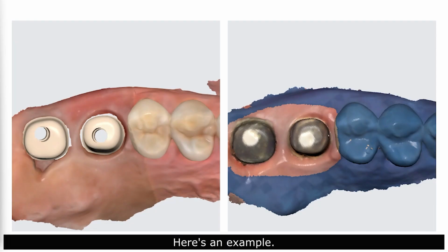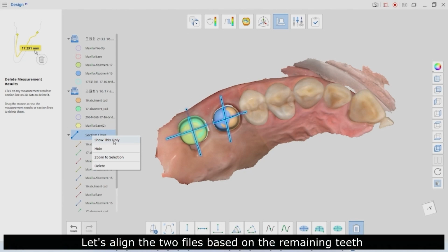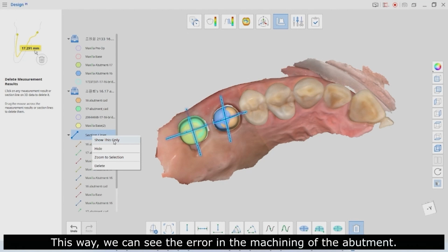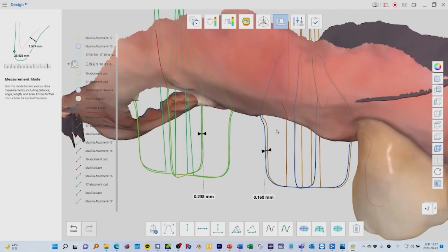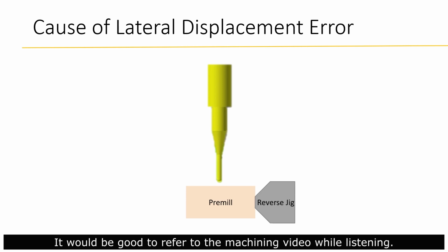Here's an example. On the left is the design file, and on the right is the scan data of patient intraoral connection. Let's align the two files based on the remaining teeth and compare the difference between the design and the machined abutment. This way, we can see the error in the machining of the abutment. The cross-section shows a lateral error of about 200 micrometer. It would be good to refer to the machining video while listening.